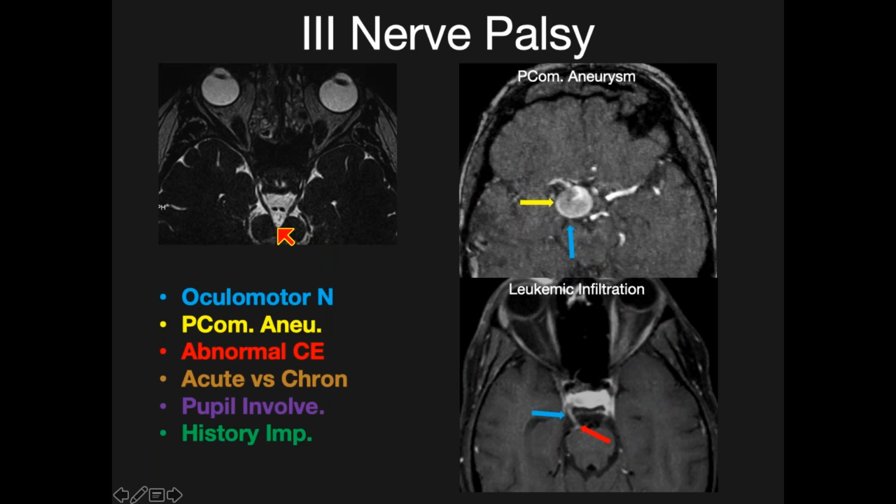We talked of that connection between the brain and the orbits via the oculomotor nerve, and this is a patient presenting with acute, painful right third nerve palsy. We do an MR imaging, which includes an MR angiogram. This shows a large aneurysm, which is compressing on the oculomotor nerve here. Not sure how well this projects on the screen, but this is where you would expect that compression.